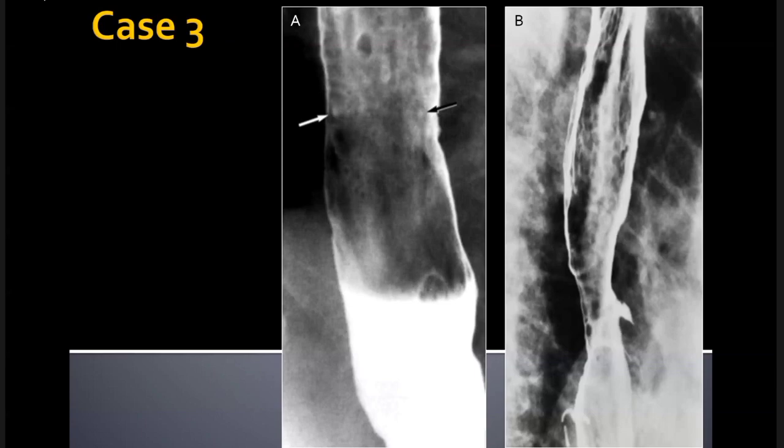I'm provided with two spot images of the barium swallow study. In the first image, there is a relative dilatation of the esophagus with mucosal granularity and irregularity. There are multiple small fillings of barium in small areas, giving target-like appearances within the mucosa.